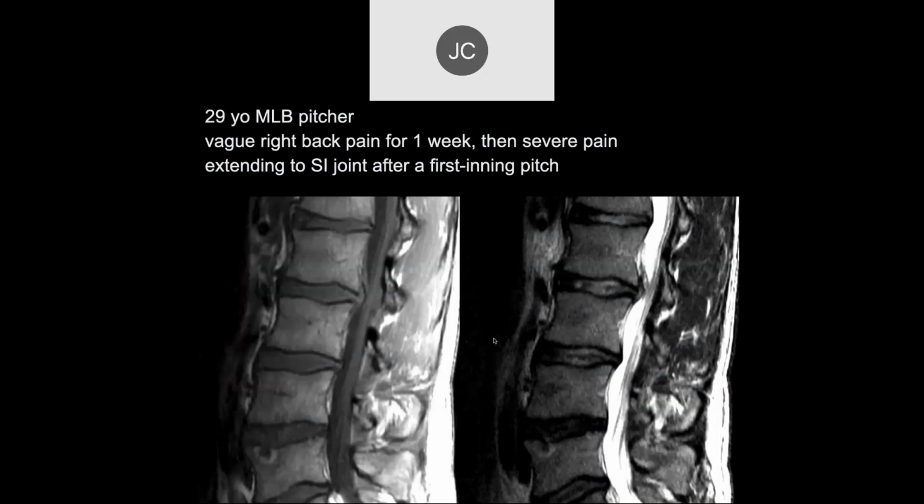That doesn't show that this was non-operated on. This was one case. It doesn't mean that all of them are that way, but at least in one case, we could see that that high intensity zone was in an area where there was a prior resorbed protrusion. We'll talk about disc protrusion resorptions too. Okay, Elior.